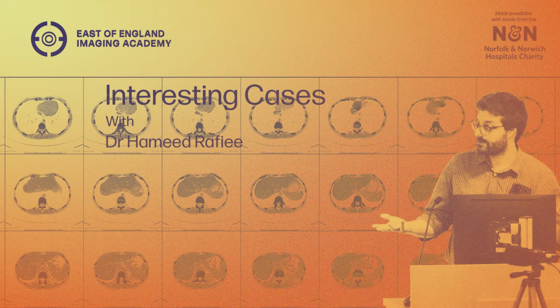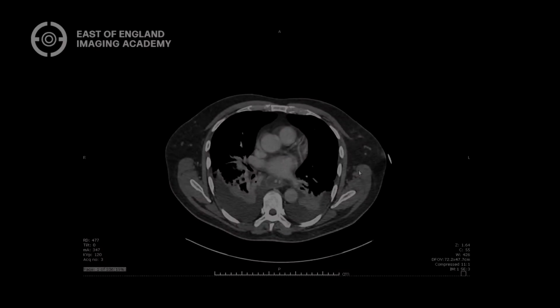Let me show you another case here. So here we've got another CT scan, and again, what I'm going to do is scroll down. I want you to tell me when you can see the fat stranding. Okay, so let's go down and see. Tell me when you can see.